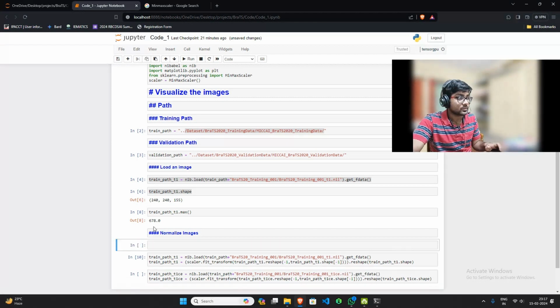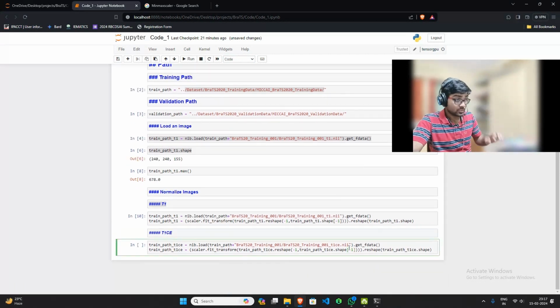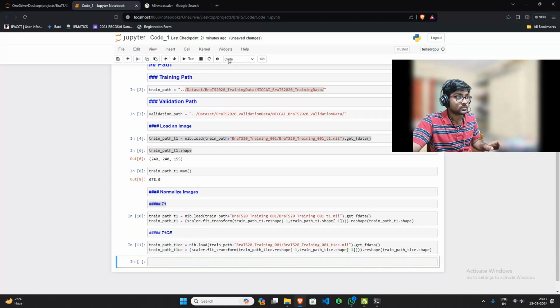Let me do one thing. I'm going to write T1, T1C. I think this should work. Yup, it's working. Next we will write T2.